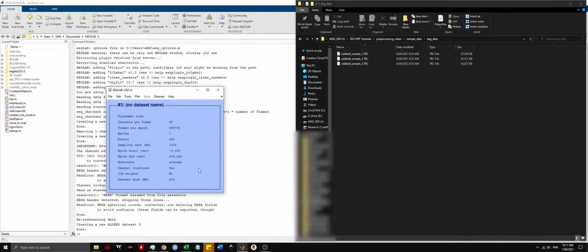With respect to filtering, filtering allows you to reduce noise by filtering out the lower and higher frequencies where the noise is present. This can help with slow drifts that occur throughout the recording, or high frequency noise that might be caused by external interference. Here I'll show you how to do a basic 1 to 30 Hertz filter. 1 to 30 Hertz filters are easy to work with, and they're generally fine for ERP analyses, but you can widen the range to suit your application.